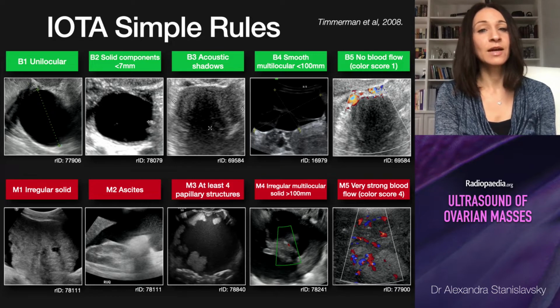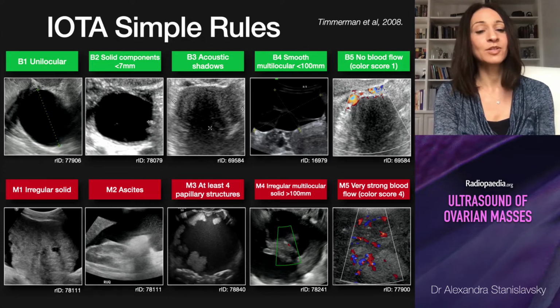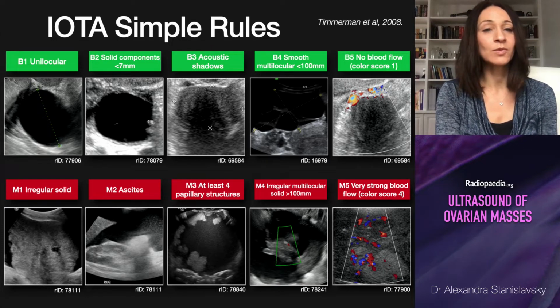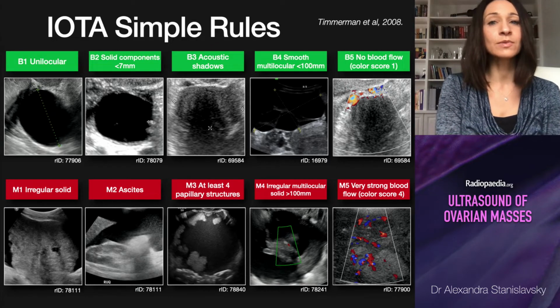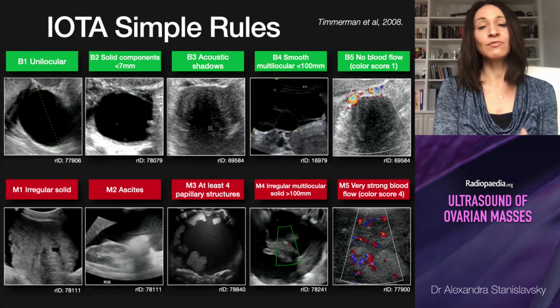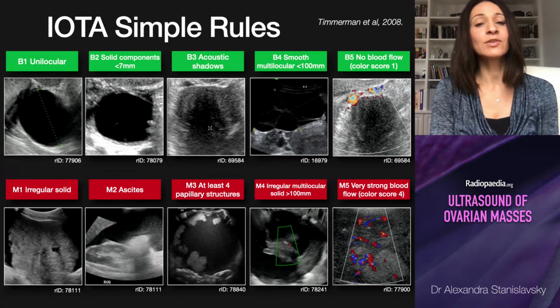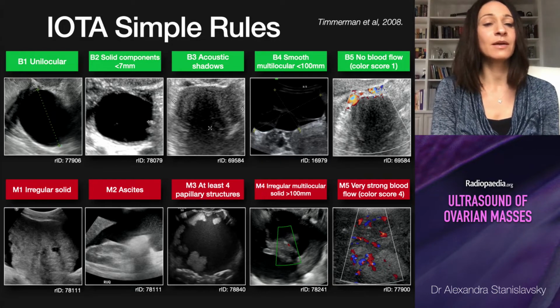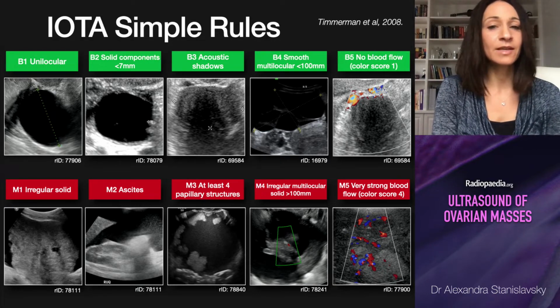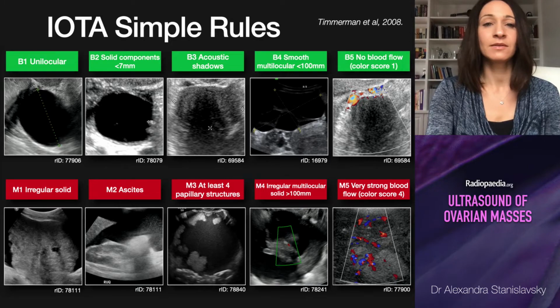And I should just point out that this image may be a very familiar picture for those who are familiar with IOTA simple rules. This slide is of course based on and references the IOTA group, and even the colour scheme references the IOTA group, but just to take note that it's not exactly the same images, because the specific cases are all out of the Radiopaedia case library and they're referenced with the case ID numbers.